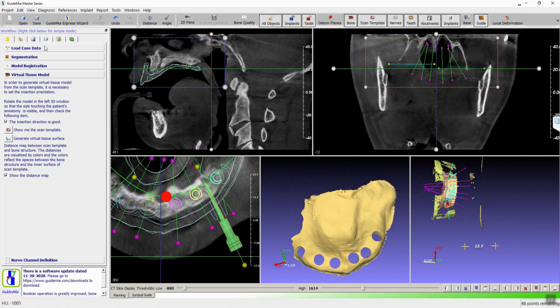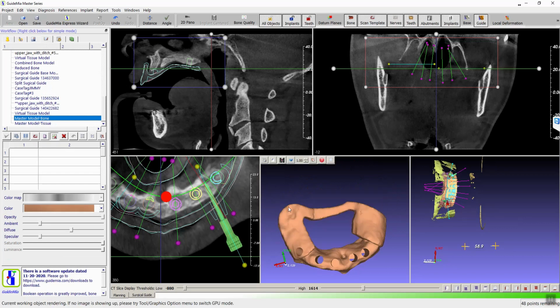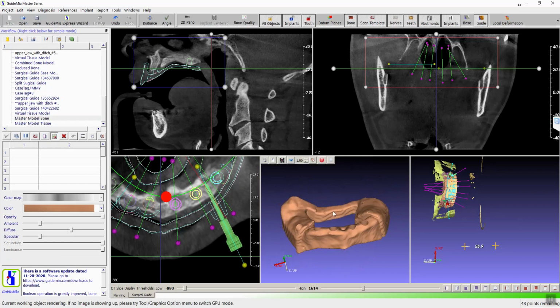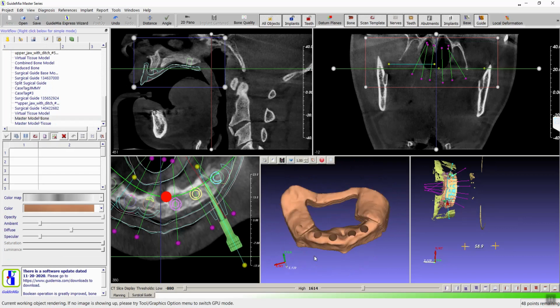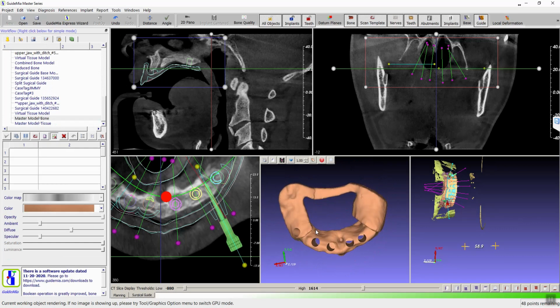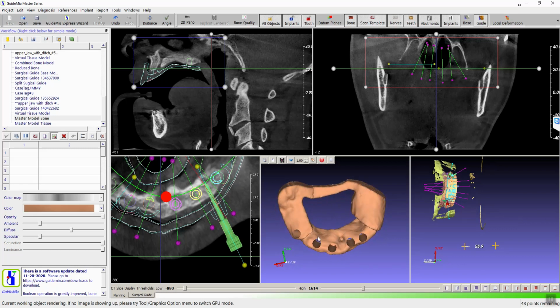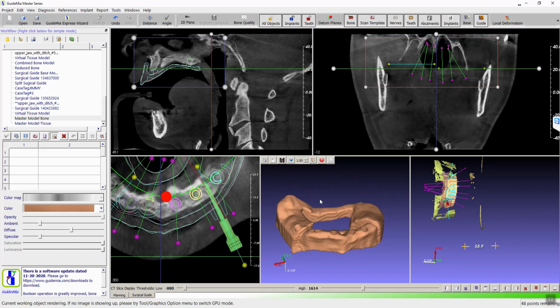And you also have the bone model with the hole here, because it treats this one as the bone model. I guess you can combine them. You can print this one, take the bone reduction guide, and put it onto this, right? You can do that too.